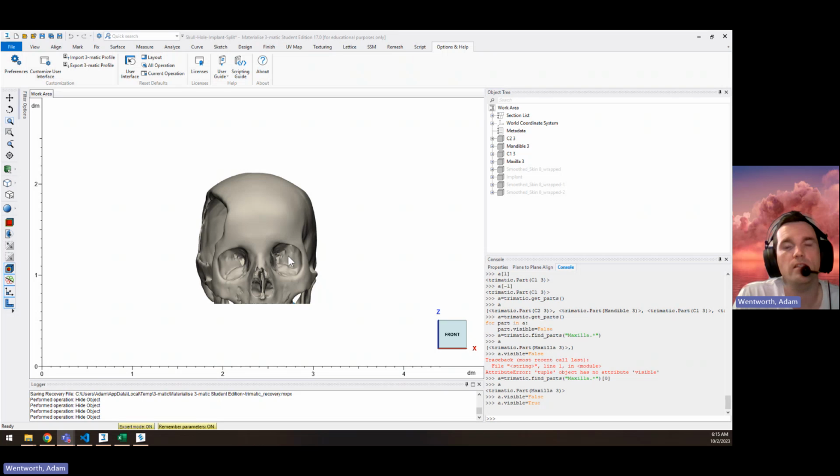And if people get a CT scan and they're not positioned in an anatomical way, like perfectly straight up and down, maybe they're tilting slightly to one side, this could have a couple of implications.